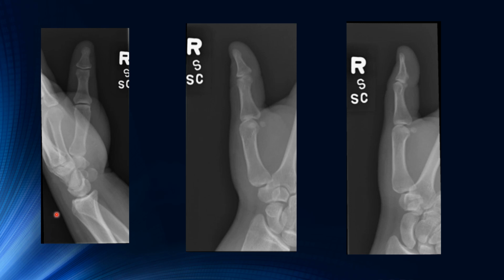For the AP view, it looks like the hand is being closed shut almost. We need to open that up to remove all this soft tissue out of the first metacarpal right here. So maybe try to extend the hand out, maybe use the other side and try to pull the other 4 digits out of the way.